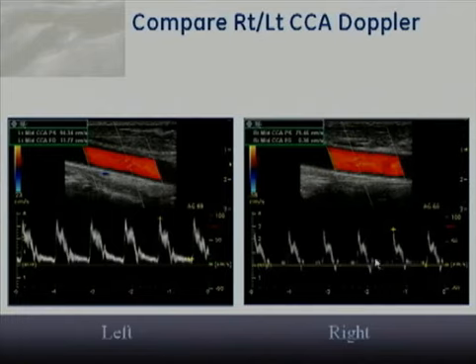When there's a decrease in diastolic flow on one side compared to the contralateral side, that tells me there's distal disease, or disease that is distal to the point where I'm sampling. Now that could be an ICA occlusion, which is probably the most likely event, but it could also be that there is a stenosis that's intracranial, and the most likely location intracranial would be at the carotid siphon level.